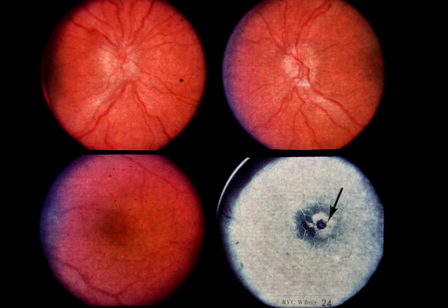The patient subsequently had placement of a lumboperitoneal shunt in an effort to prevent permanent optic nerve damage from presumed chronic increased intracranial pressure. However, despite a functioning shunt, she continued to have bilateral decreased vision and optic disc edema. When examined at the Wilmer Institute, the patient had visual acuity of 20/40 OU and bilateral anterior chamber and vitreous inflammation. Upper left and upper right.